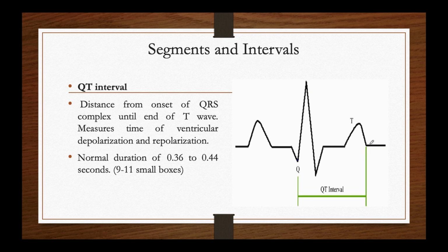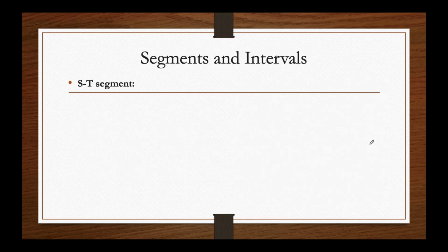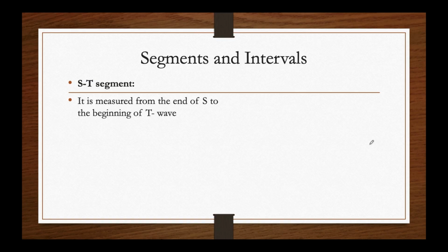Now we also move on to see our ST segment, and the ST segment starts from the end of the QRS complex.